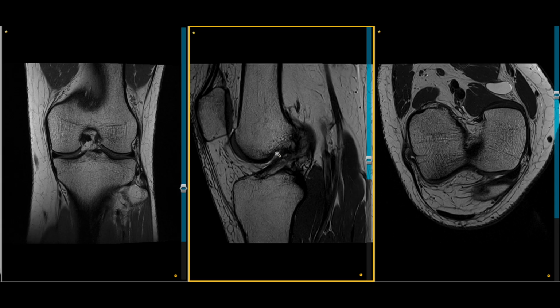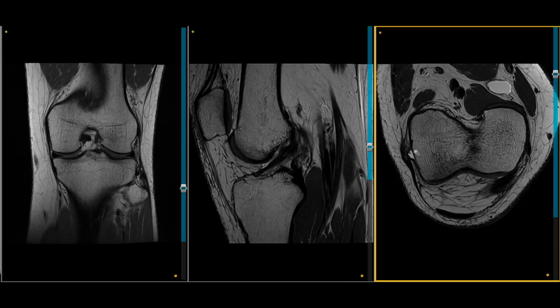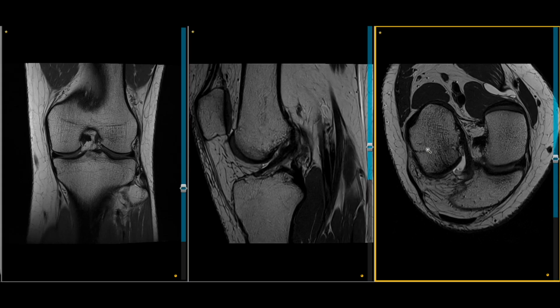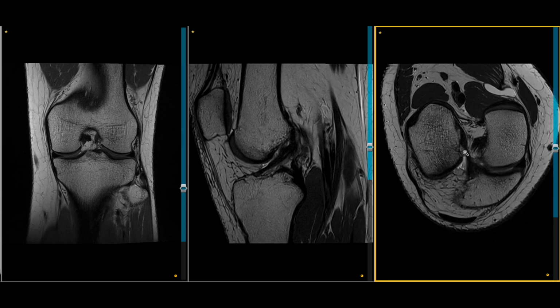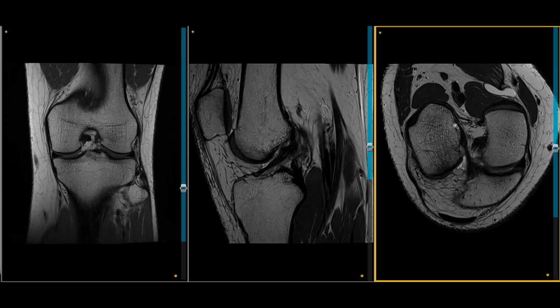And as I scroll one slice over, you can see the fibers also extending to the native femoral footprint of the ACL. This higher signal in the middle reflects the gap between the two attachments of the ACL onto the femur. This finding is also demonstrated here on the double oblique sequences, with this being the lateral wall attachment and this being the femoral footprint attachment.